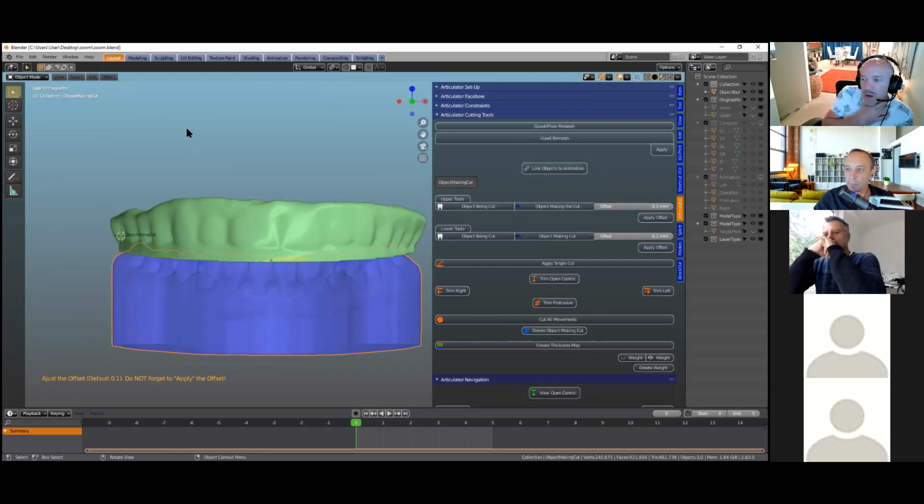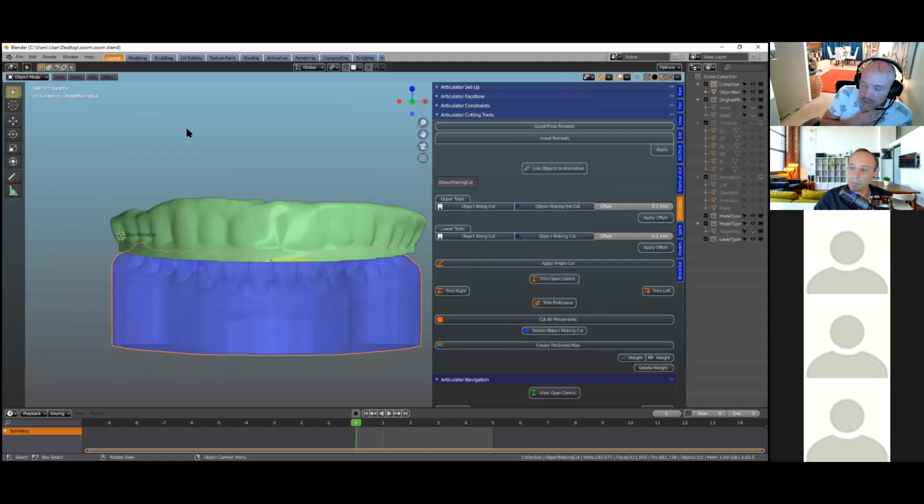So there are a few ideas behind this whole thing, but some users have forgotten to do it, which is okay because you can still save your splint by using the clean button in the model designer. Michael, can this offset be made quite a large setting instead of 0.1? Say you want more clearance, could you make it 0.3 or something like that as well?